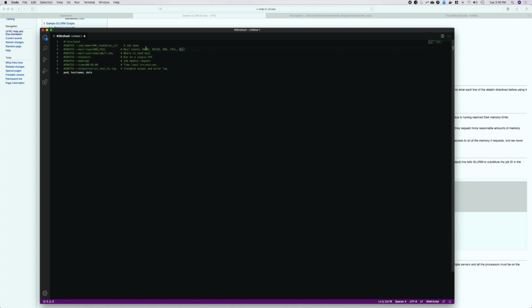A lot of people like begin in there as well. If you want begin and fail, then that would be all. But I just like end or fail. I know when it starts after I submit it. So then I'm going to change my email, but you can put in whatever you want. So I'm going to put my email in there. And then number of tasks 1 is good.